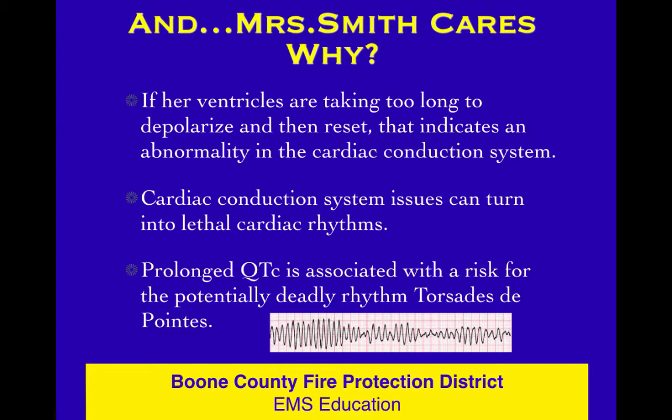And there's that really scary rhythm, torsade de pointe, or torsades, or TDP, and obviously I don't speak French, so I didn't say that right, and no one can spell it, so don't worry about that. But it is a particularly scary, deadly rhythm. It's polymorphic VTAC. It's VTAC coming from with a number of shapes, and it's kind of a strange little rhythm, and we'll talk about it more in a future lesson. I just need you to know right now that a prolonged QTC puts your patient at risk for torsade, and torsade is scary and potentially deadly.